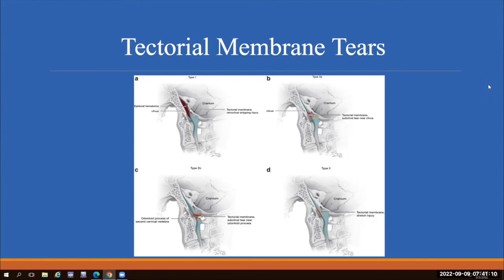So at our place, the CT will be done first, and then potentially the MRI second. But really, it's a complementary role between CT and MRI. Both are going to allow you to evaluate to some extent the integrity of the tectorial membrane. But MRI is going to be the one that allows you to determine specifically whether or not that ligament's intact. If that makes sense.